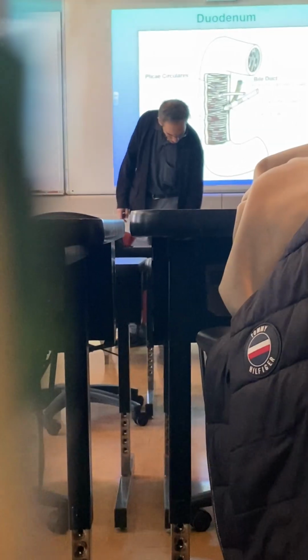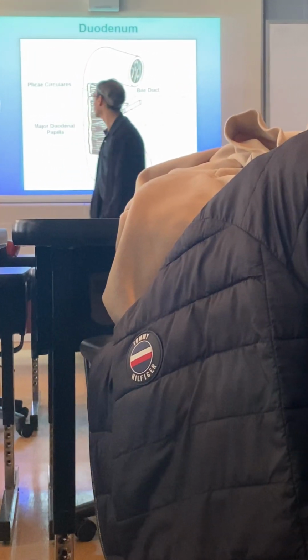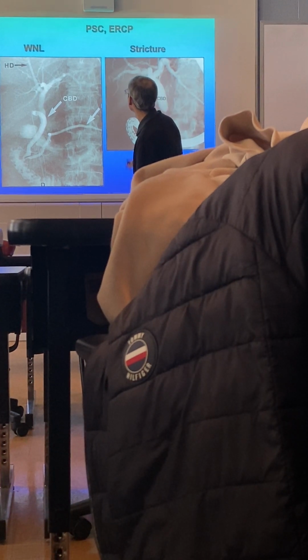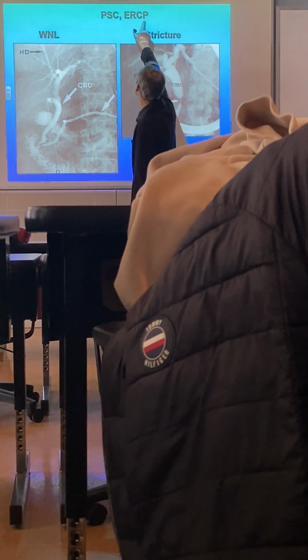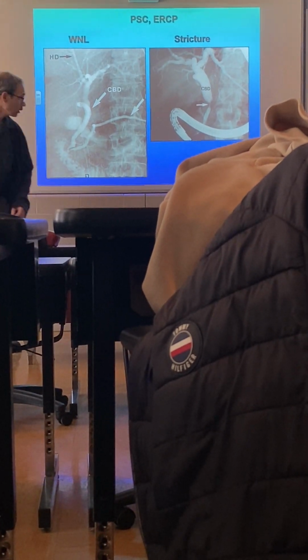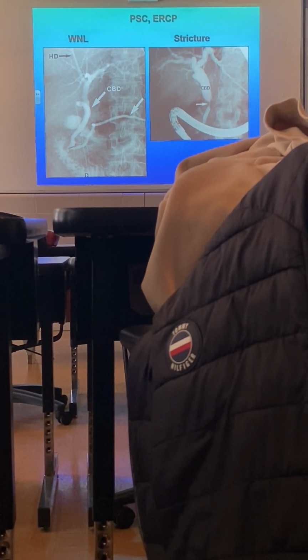called Scarring and Stricture of the biliary tree. Let's take a look at an example of some stricturing that happens. We're going to look at this endoscopic retrograde cholangiopancreatography, a type of radiographic study in which we inject the biliary tree with a radiopaque dye. The dye flows retrograde up the biliary tree, and you can see all the different areas that are dilated and strictured.